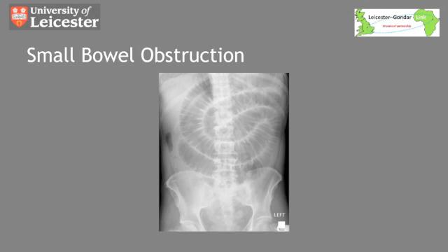Large bowel obstruction can also give dilated small bowel in the presence of an incompetent IC valve that allows reflux of air backwards from the cecum into the small bowel. Large bowel obstruction without small bowel dilatation is at higher risk of perforation, as it suggests a competent IC valve and therefore is a closed loop with constantly increasing pressure.